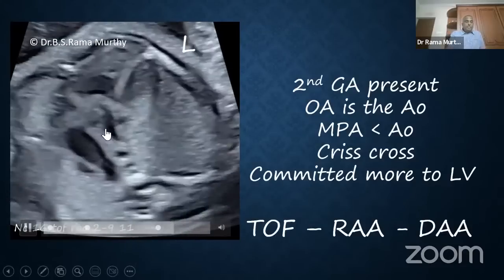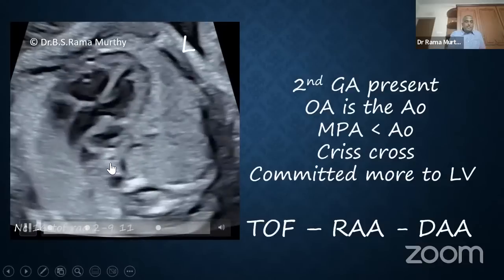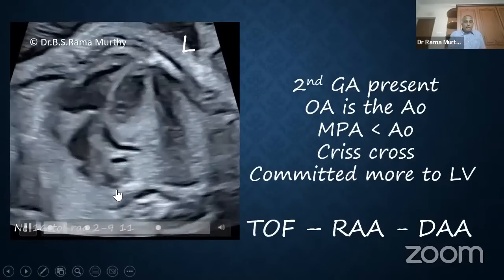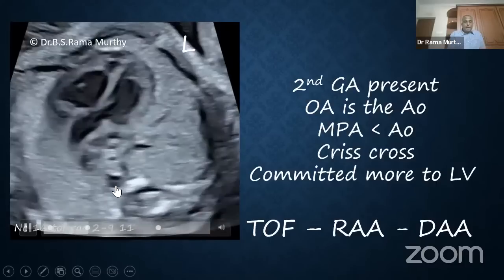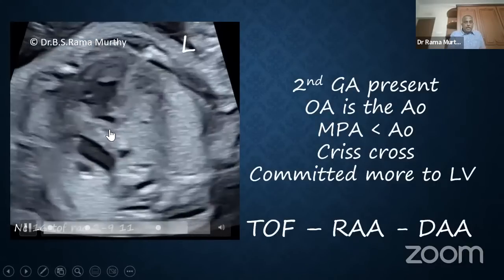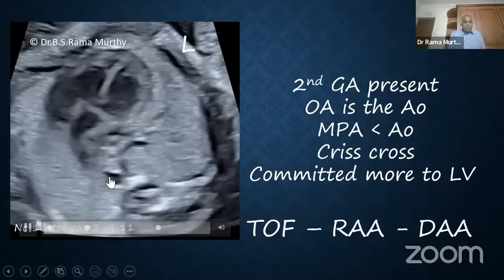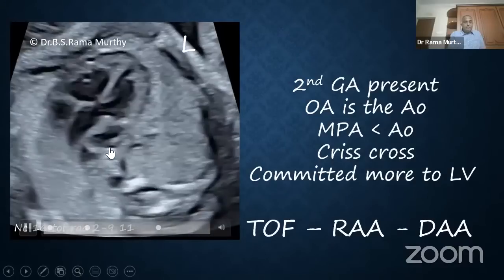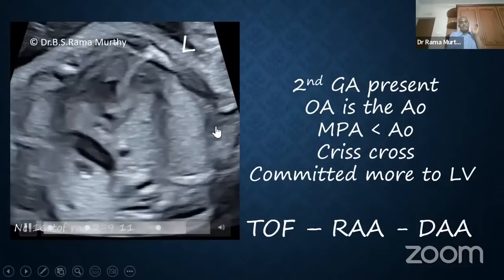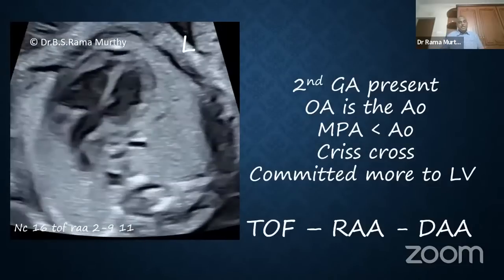And also I'm used to the pulmonary artery, which is communicating with the descending aorta to form the ductus arch. Yes or no? This is a descending aorta. But I'm showing you the entire clip up and down. Do you find the pulmonary artery extending all the way and coming here to the ductus arteriosus? No, it is dividing. There is nothing, no ductus connecting the main pulmonary artery to the descending aorta. I hope this is clear, and therefore I'm going to diagnose a ductus arteriosus agenesis.